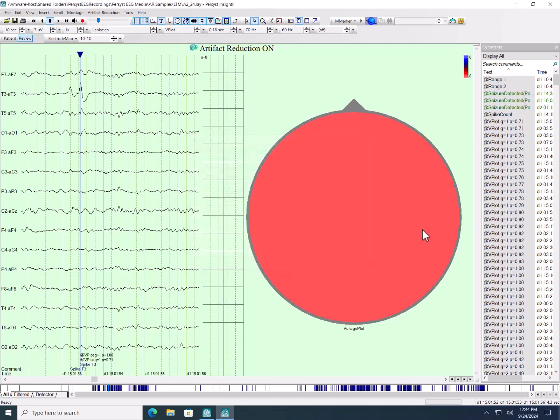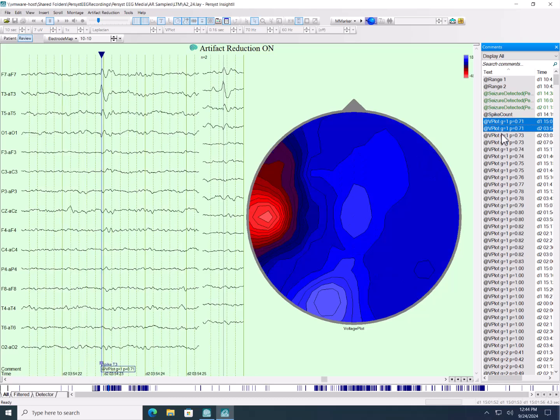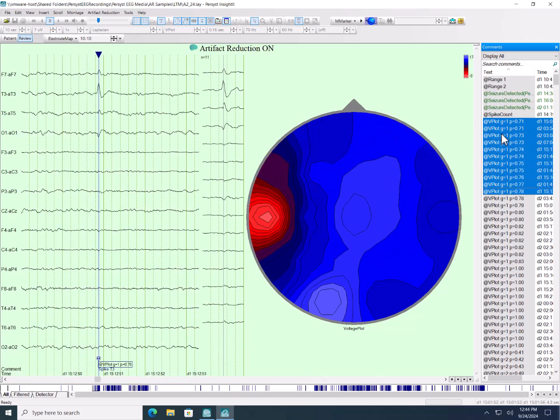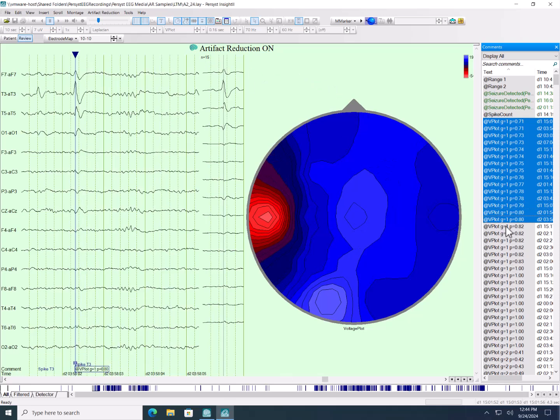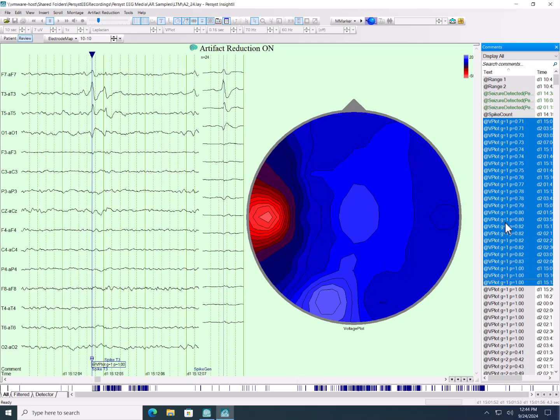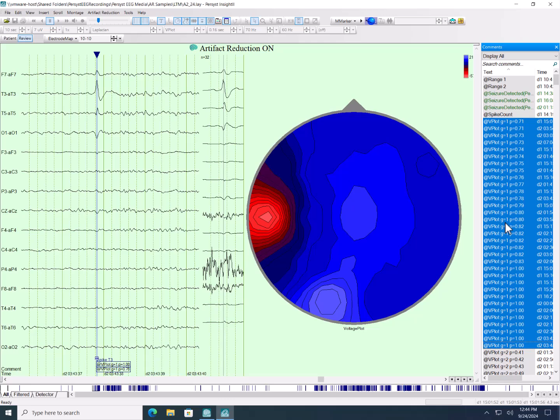So what does that do? Well, I'm going to pick this voltage plot, event, and again, that's one of the spikes I marked in Spike Review. And what I can do is just keep adding to this average. I'm holding down the shift key and clicking that down cursor arrow on the keyboard, and you can see that now it says n equals 15. So I'm incrementally adding to this, and frankly, I'm back averaging this.